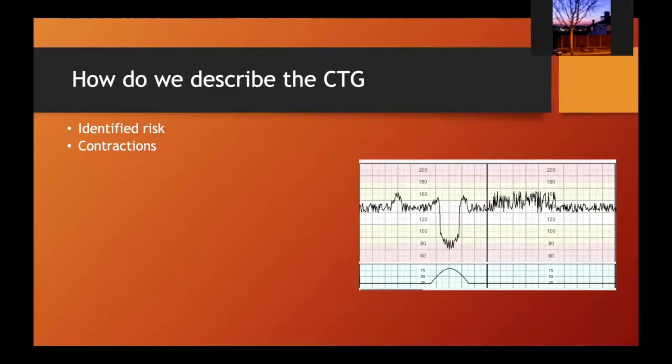Baseline would mean that most of the time the fetal heart rate is maintaining that rate, at least more than 2 minutes in the length of 10 minutes to determine it. Did you hear what she just said? That's missing something very, very important. No acceleration.